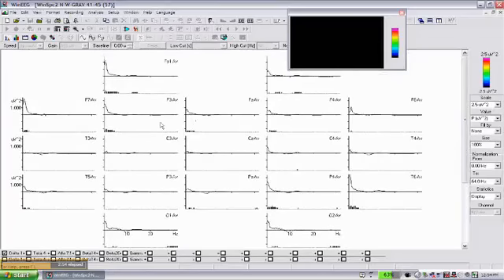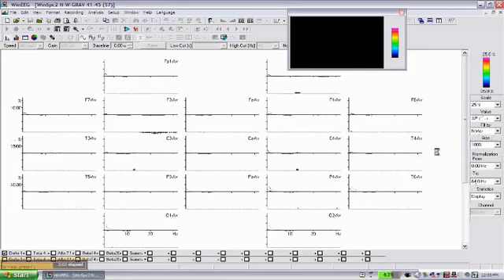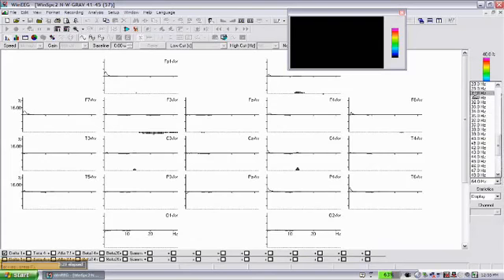And we can do this comparison in absolute power, we can do it in amplitude, and we can do it in relative power. To make comparison in relative power, just simply click in value and select this option, %P, and I usually normalize the spectra, so I am using normalization frequency band from 3 up to 30 Hertz.